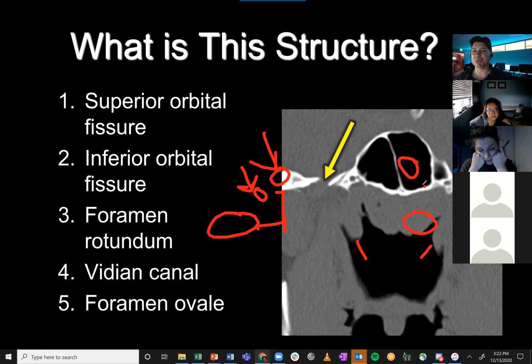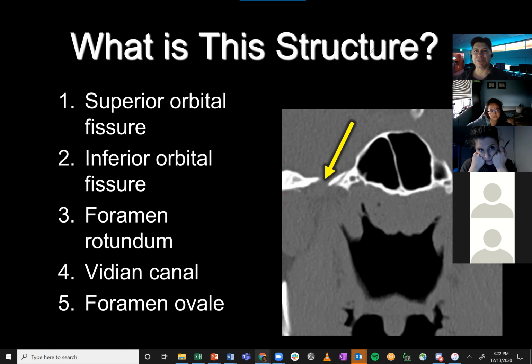Foramen spinosum. Foramen spinosum. And what goes through there? The middle meningeal artery. Middle meningeal artery, right. Very good. So that's how you find foramen ovale. Find the condylar head, find the medial part, go a centimeter medial, and then a centimeter anterior, and that's foramen ovale.